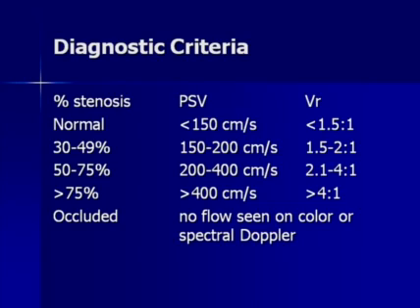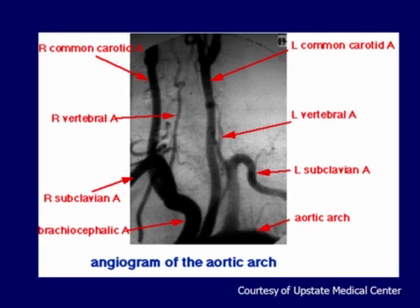And you're not supposed to say all or none or always or never, but this is a time where this almost always holds true. So 2 to 1 ratio, 50%, 4 to 1 ratio, greater than 75%. And again, we'll see this focal change.